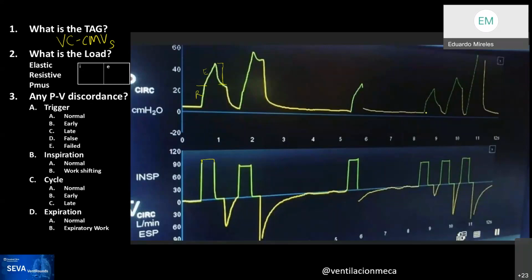You can see the big step on the resistive step. The next one, you can see how the steepness of the compliance part goes up. And in the last breath, in which now you have three breaths on top of each other, the steepness is horrendous. So it starts with resistive on this one, and then it just starts going into an elastic load of hell, in which you have distended that lung to a humongous size.